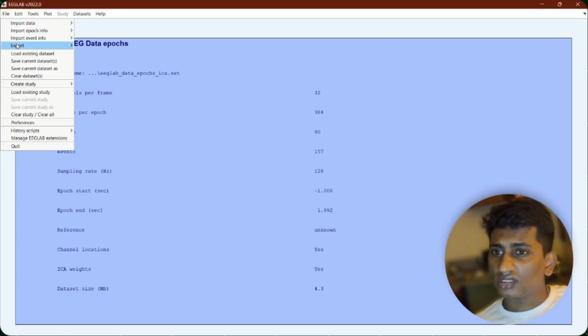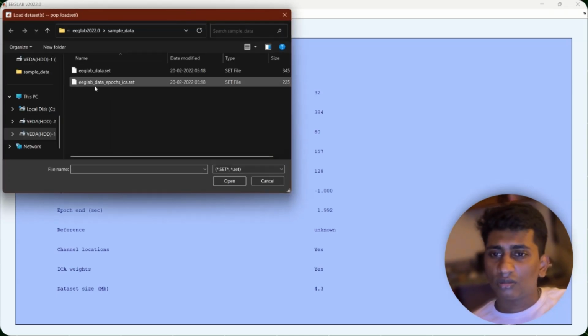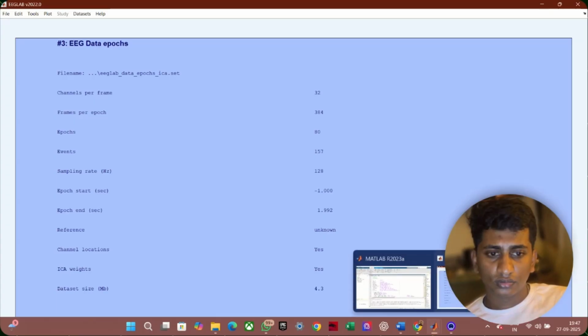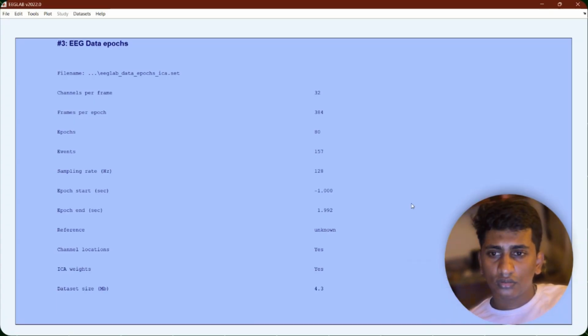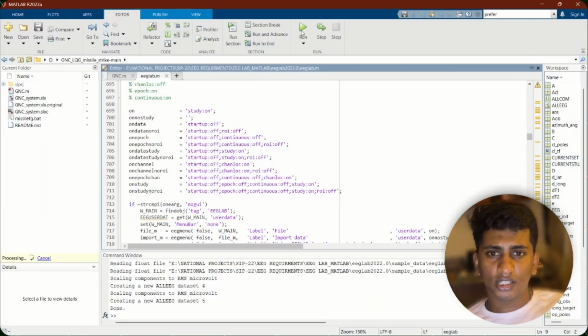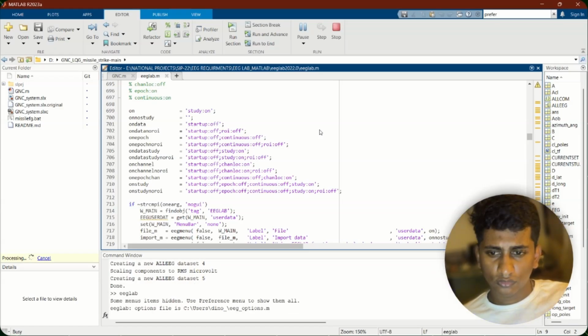Okay, so the dataset summary is here. Oh, okay, this is not the data. Just a second. This data is not processed fully, so yeah, it'll take some time. Okay, we'll run it again.